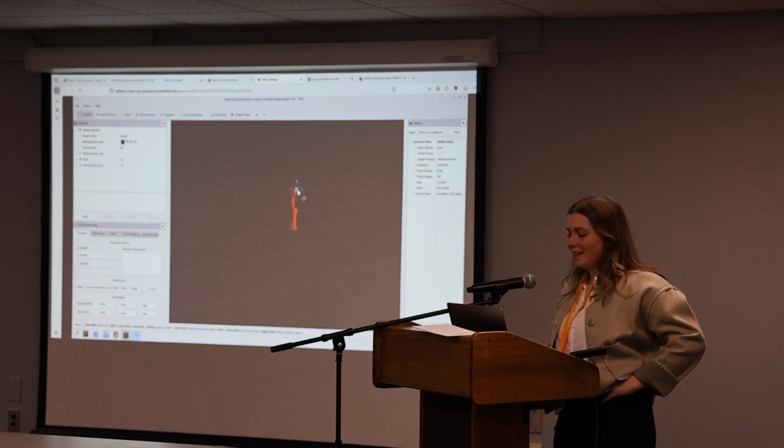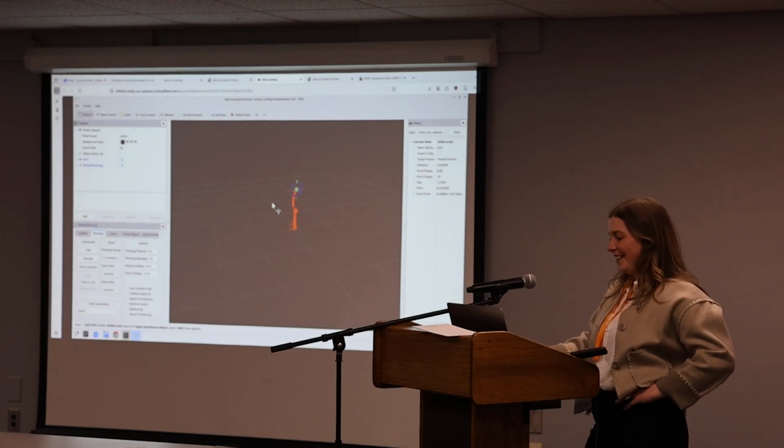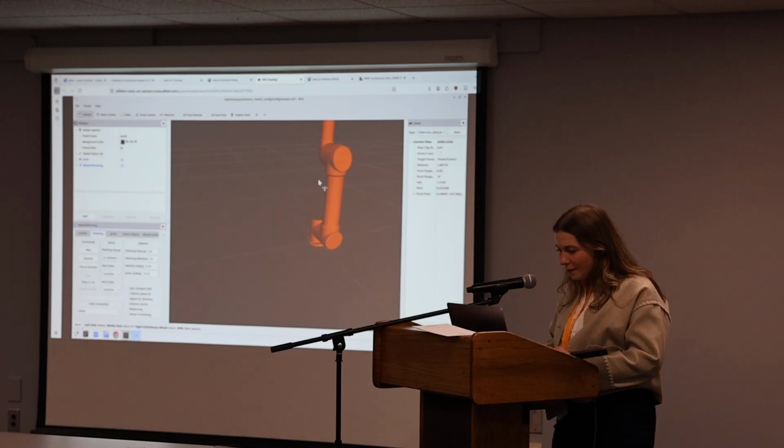This looks like it might be a little better: ROS local host only, one. If it doesn't work, maybe you should try this one. Okay. It looks like it's working roughly.